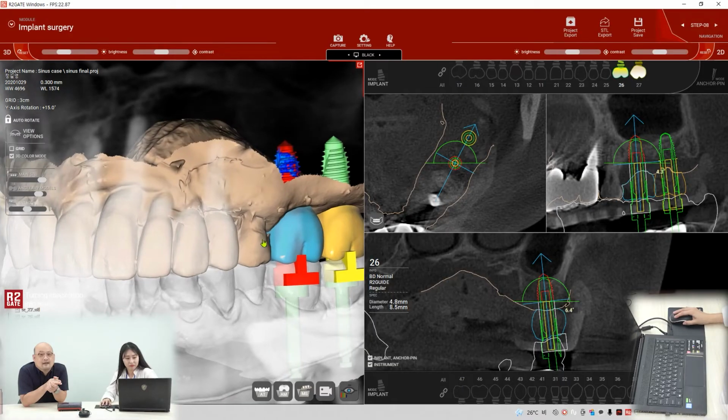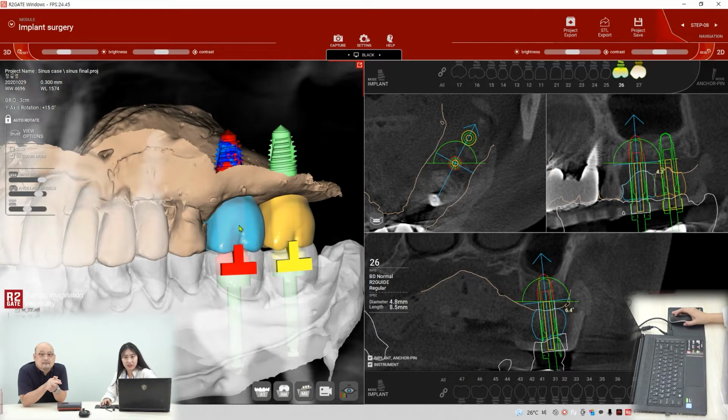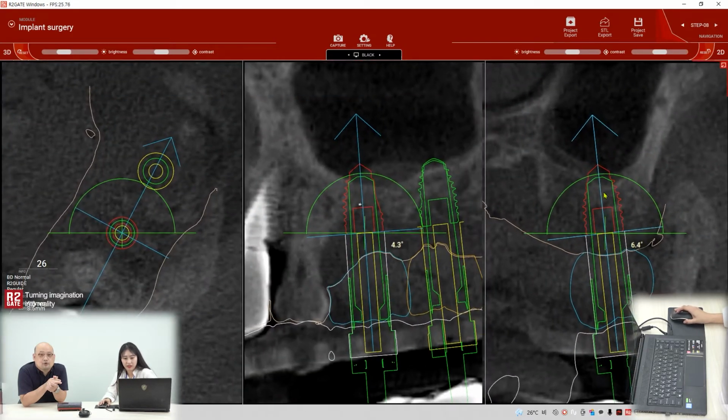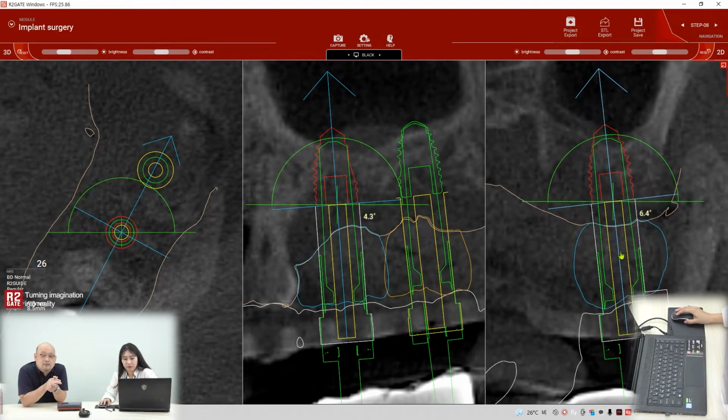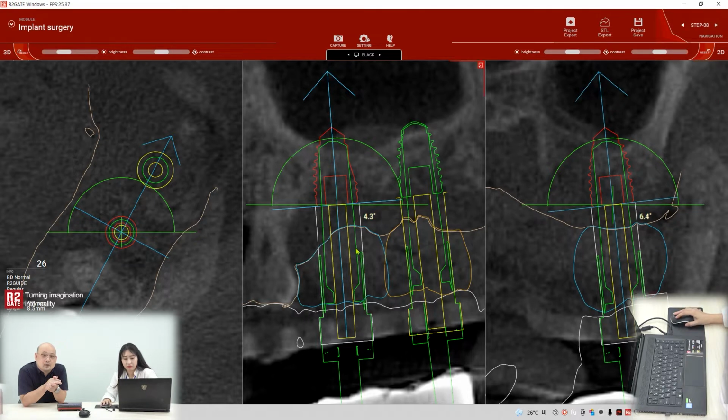Okay. So we're gonna do another case today. Do the sinus case, and then there is already another case. Let's preview the case. So which case do we have? Two molars, 26 and 27. And the two implants are placed already, and there's something different, not an implant.